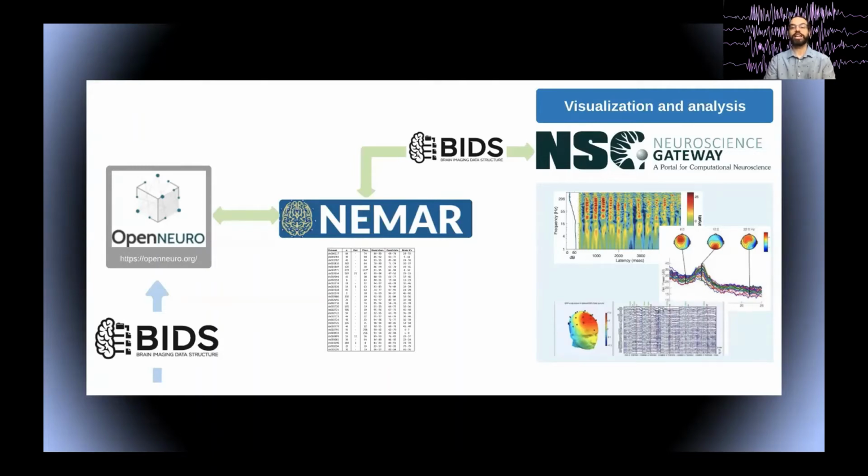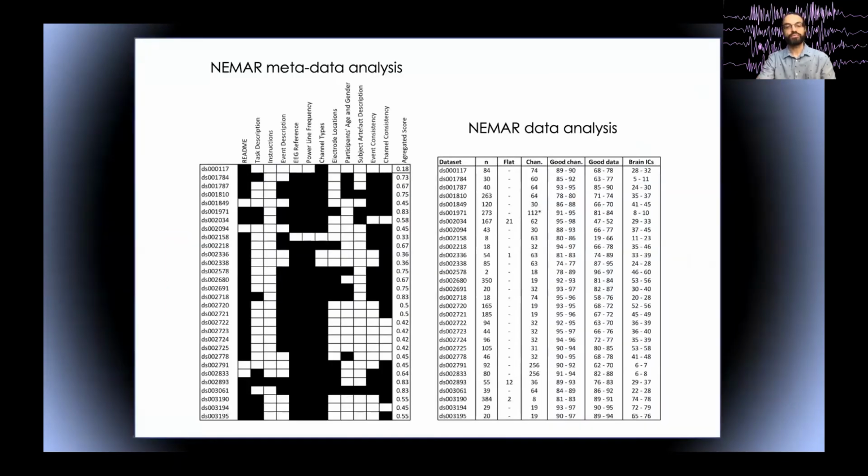So you'll likely be able to select one of these in case you want to apply your analysis method to one of these datasets, and you'll be guaranteed that these datasets have all the information necessary to process them and can be imported in EEGLAB. They'll also be pre-processed, so we will have a pre-processed version of these datasets.